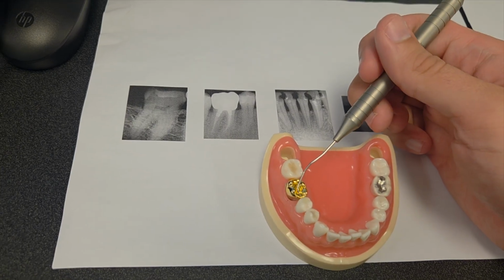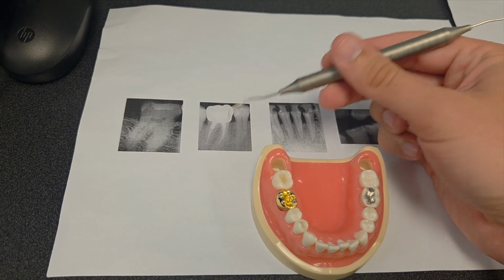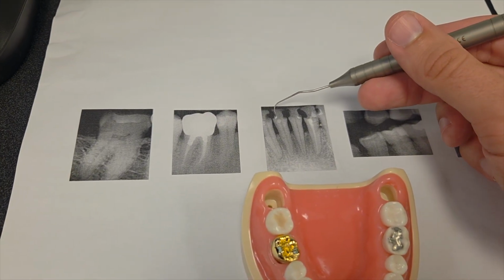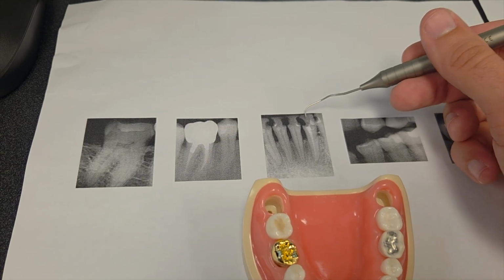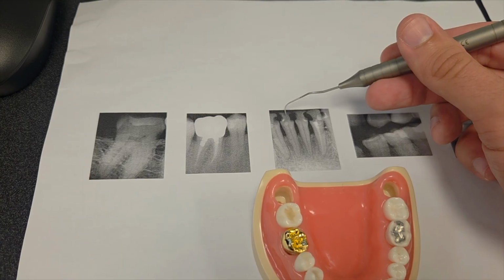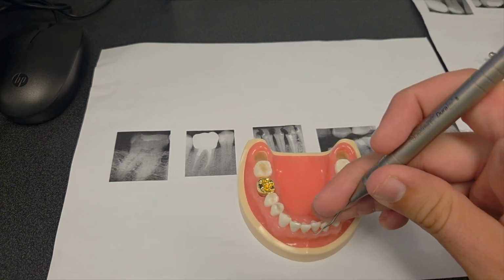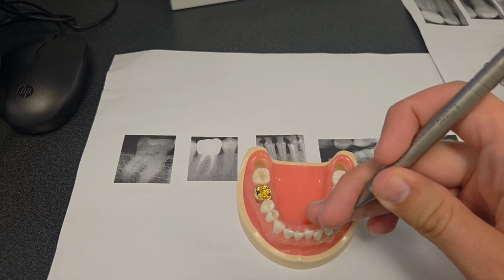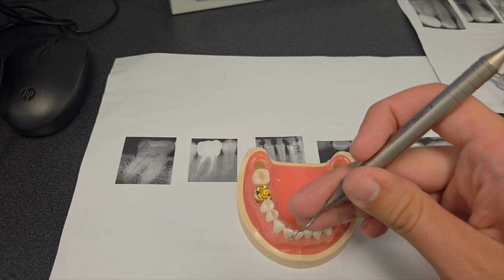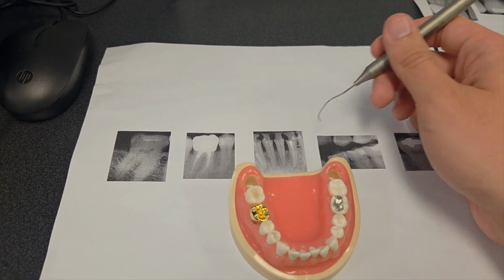Based off the x-ray, we can see that it's actually a golden crown with the root canal going through the roots. In our next x-ray, we can see these are a type of composite that shows up on teeth that shows up radiolucent or dark. And then we can go onto our model and we can feel those spots actually. So we'll chart those, and those are mesial and distals across.